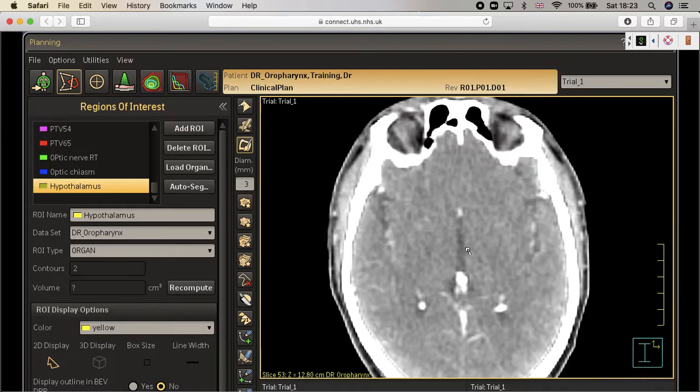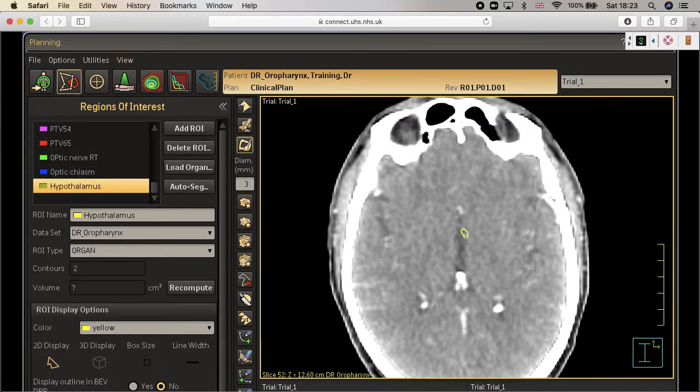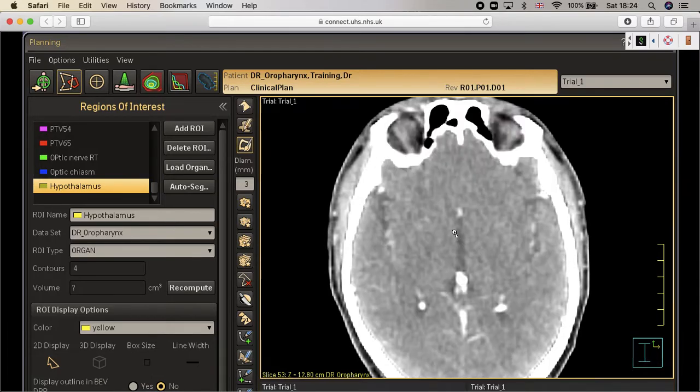What I would do is go to the slice below the anterior commissure, and start to draw a 3 millimeter thickness structure. So, 3 millimeter structure on either side of the commissure. Don't take the commissure now. Go down below, 3 millimeter structure on either side of the commissure.